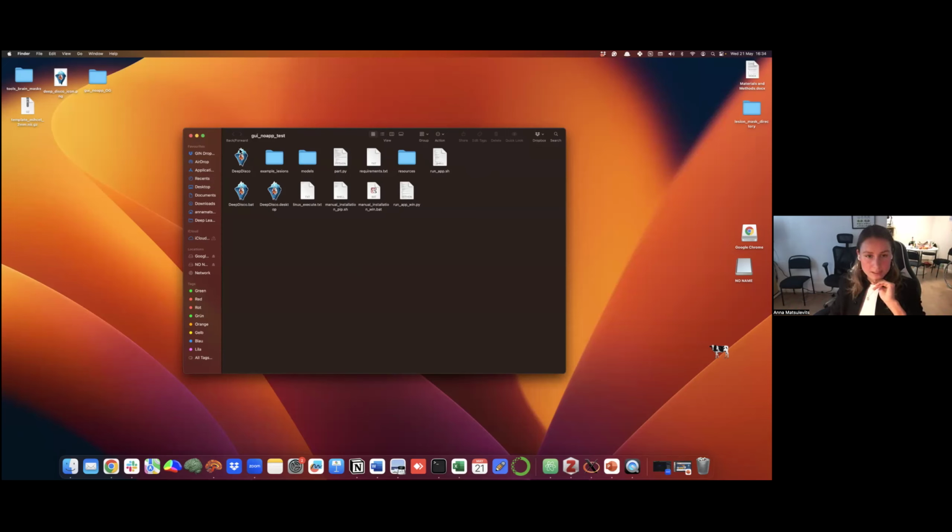If you're using a Mac, then you just click on Deep Disco. I think it's called Deep Disco Command or something. It might have an ending, it might not, but it's just Deep Disco or Deep Disco Command. If you're using Windows, then you click on deepdisco.bat. And if you're using Linux, then you click on deepdisco.desktop.